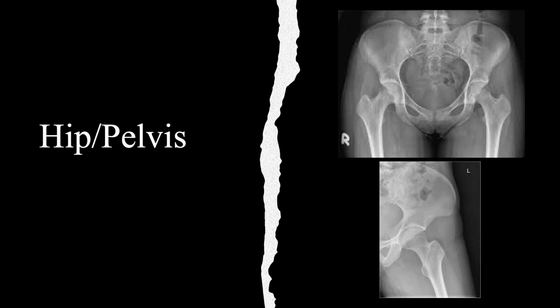Then going down from there, look at the femoral head and neck. I like to go top to bottom and do the same thing every time. Make sure that the head is centered in the acetabulum. Then especially in young adults or kids, you want to look at the apophyses for any asymmetry and signs of avulsion fractures. Anywhere where there are bony tendinous attachments, you want to look to see if there are any avulsion fractures or other types of fractures, because those are weak points in young adults and children.